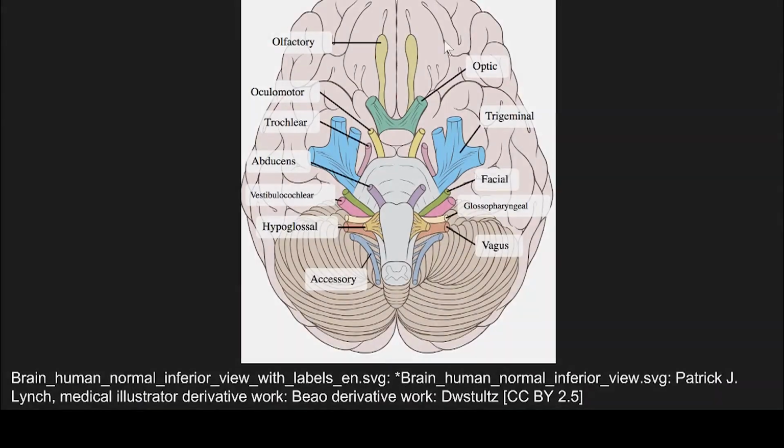Now, before I show you some sixth nerve anatomy on MRI, let's just do a quick review of what we've covered so far on the cranial nerves. We talked about the olfactory nerve, cranial nerve number 1. We've got an olfactory bulb, and then as it comes back, we don't show it here, it divides up into 3 or 4 different segments, which are outlined in the olfactory section. Then we get into the optic nerve.